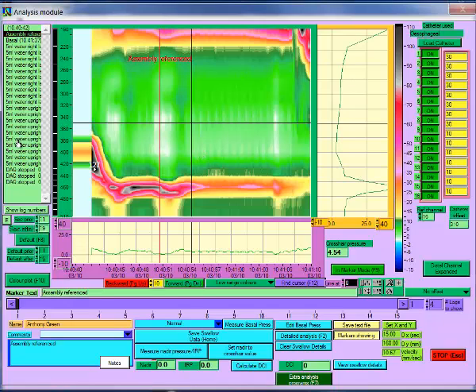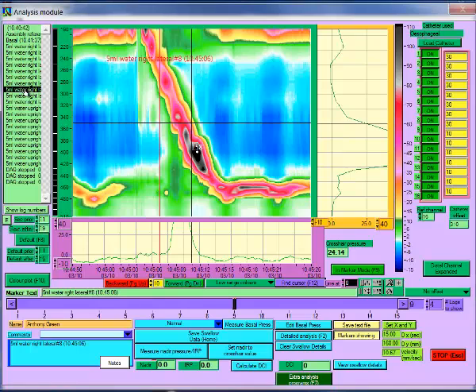Data can be displayed either according to the markers entered at the time the data acquisition was performed or by its position within the data log file. When the data is displayed according to the marker, the number of seconds before and after the marker is shown in these two controls. The text associated with the marker is displayed in the marker text box.